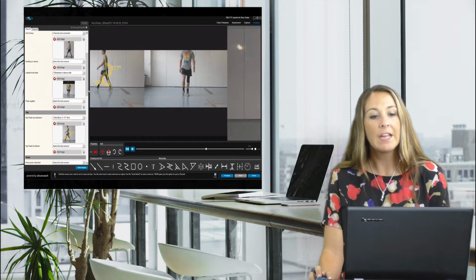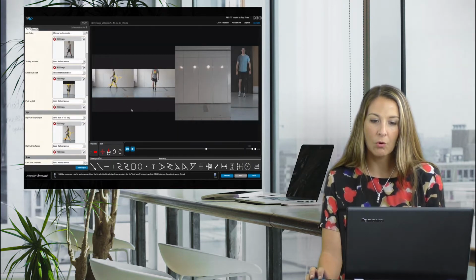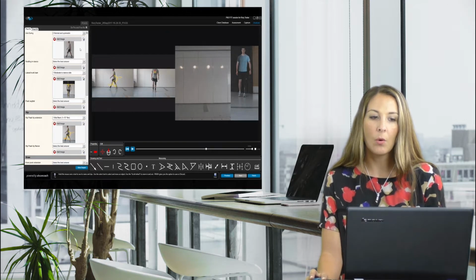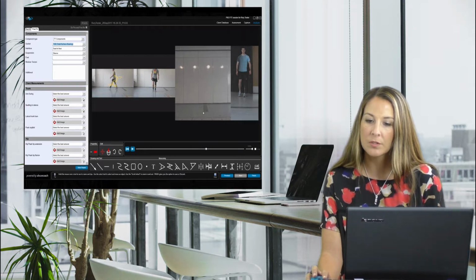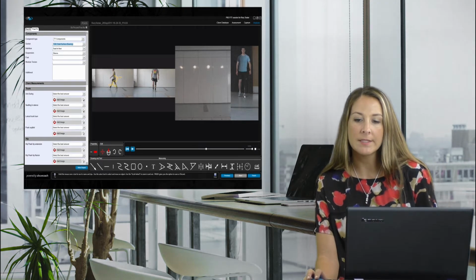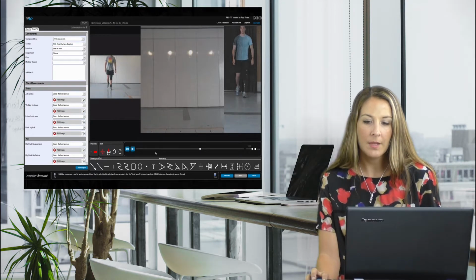Like I said, if I was conducting a pre and a post, what I would do is I would complete my pre, and then I will scroll out, and then I can just click over here and I can scroll in over on this side as well. So I would go over to my post fit and say, okay, so now he's had his post fitting. He's got a new prosthesis with a dynamic response foot. Let's take a look and see how he's improved. And so I'll go ahead and just show a few images there.